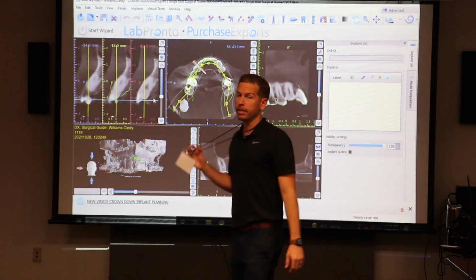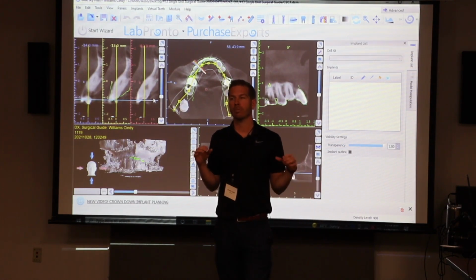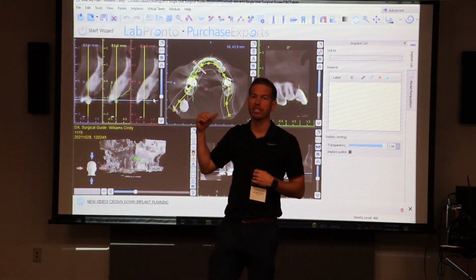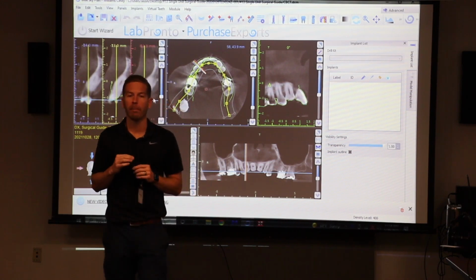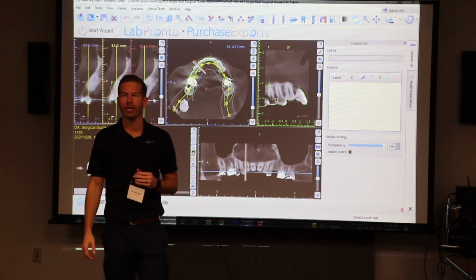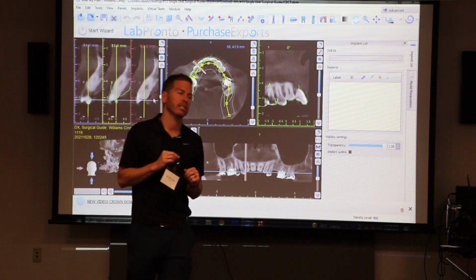All right. So I wanted everyone just to get a little hands-on with the software and do a brief overview, because some of this is setup, right? And it's really important to know the proper setup before we jump in and I say, okay, let's start doing a guide. And you're like, wait, you lost me on setup. So there's some setup here, understanding basic software.